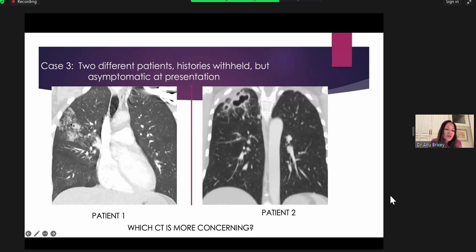And what you see here is all of these areas of bronchial thickening surrounding these small airways here. There's definitely tree and bud nodularity that's present. And you see this opacification here. Perhaps this is an airway that's completely plugged up. There's certainly a degree of bronchial thickening. Maybe this is an early cavity, but it looks more like bronchial thickening and then occluded airway here, but a lot of tree and bud nodularity.